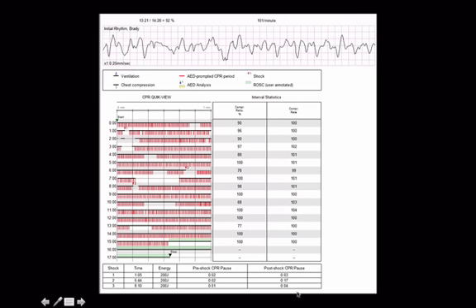You recall with the ALS or the ACLS now, our goal is to resume compressions immediately after the shock. You can see these up here as these little triangles with a number. This is shock number 2. You can see there's a short pause before, a little bit of a longer pause afterwards. Shock 1, relatively short pause both before and after. Same with shock number 3.